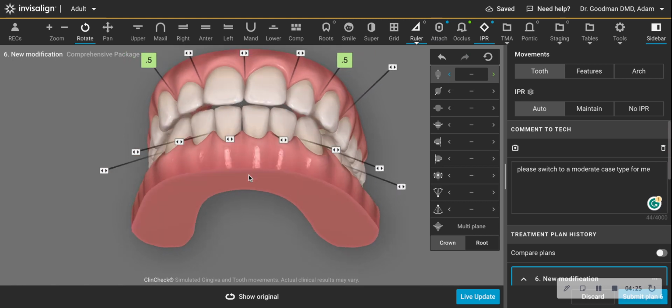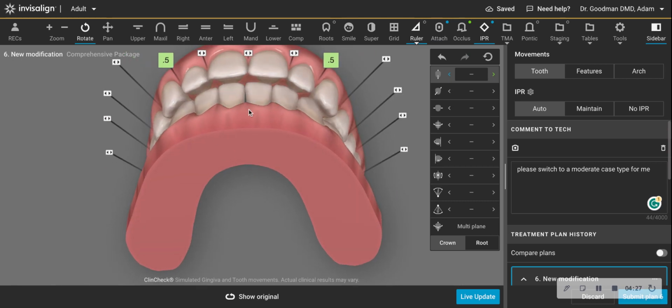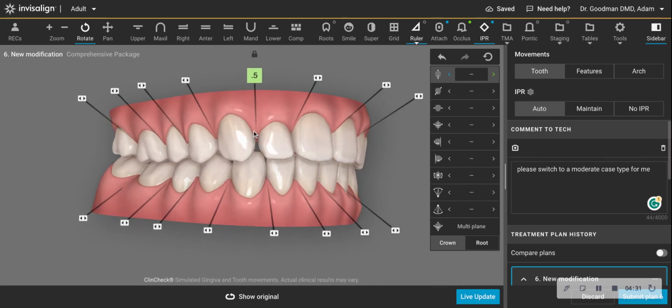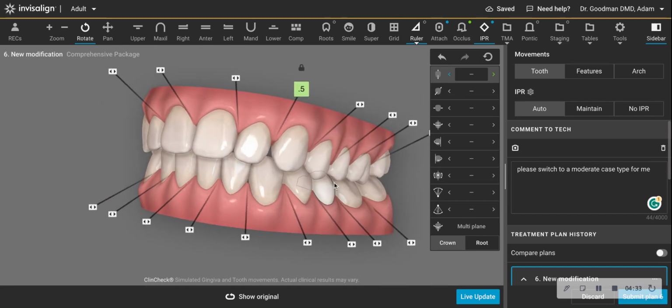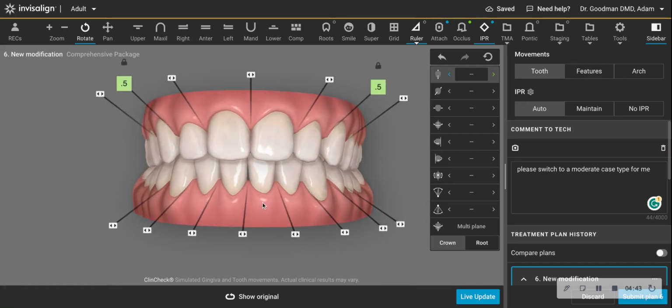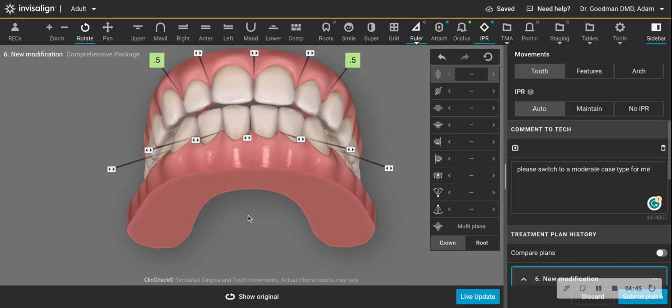And now, while it seems like a lot of overjet at the end of the treatment, I don't think we're going to end up getting that. Having this space here will allow you to avoid the anterior collisions. And at the end of the treatment, you can then say, hey, I have those spaces, but I don't think I need them, and just tighten them up very quickly. But you want to avoid anterior prematurities.